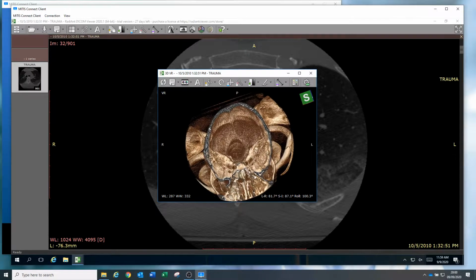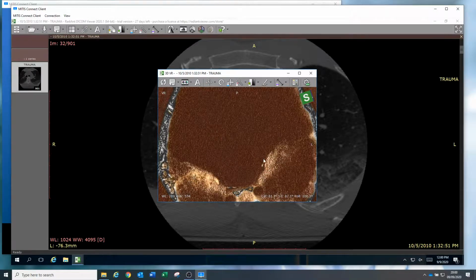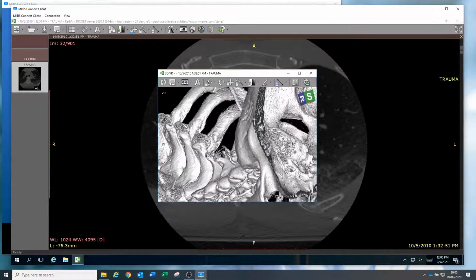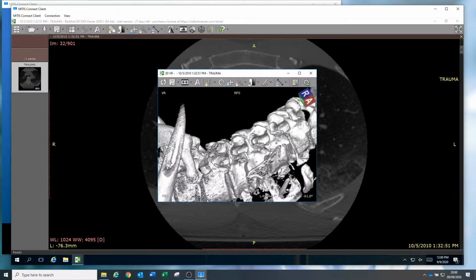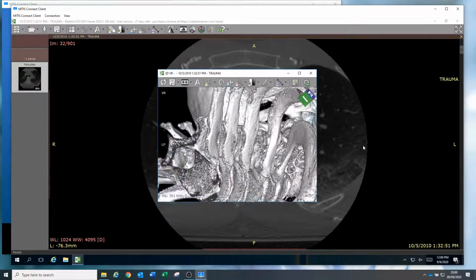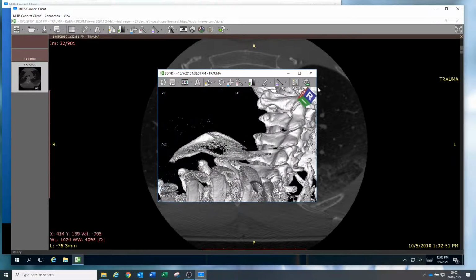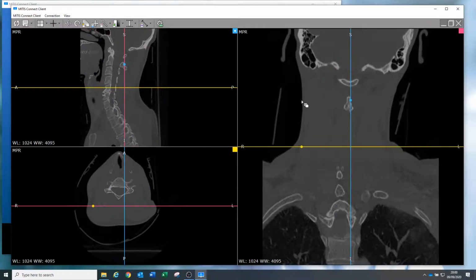We can then go and zoom in, add and remove layers of the scan, and further rotate the image, really harnessing the power of this lossless environment. We're now going to show you the MPR aspect, which is highlighting how many slides and how many instances we can have running in parallel to really emphasize the power of the MITIS protocol.